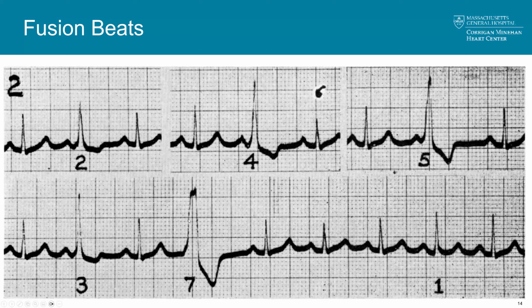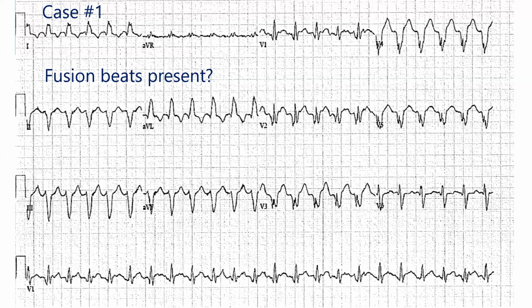And as you can see here, beat to beat, you see a very sudden change, right, in the morphology. So you're not expecting to see this sort of gradual change that could be respirophasic and could be a function of just change of the position of the heart with respiration, change of the position within the chest, thus changing the vectors with respect to the placement of the leads on the surface of the chest, which don't change with respiration. So the question here is, do we see any fusion beats?